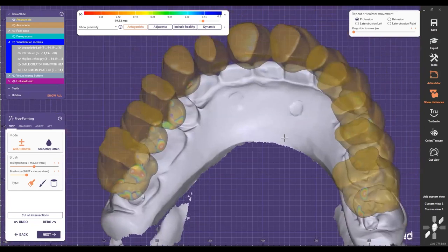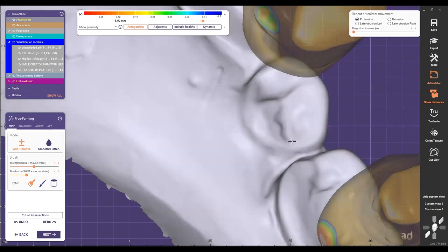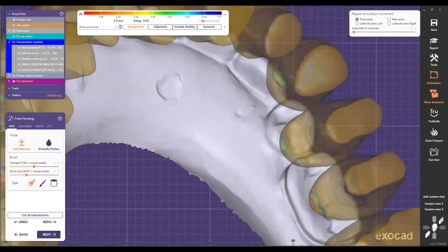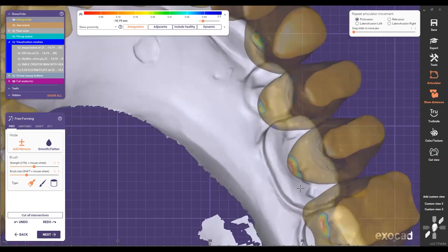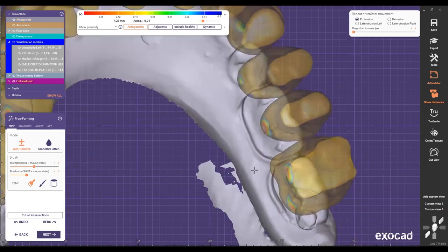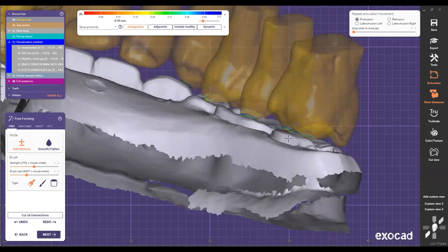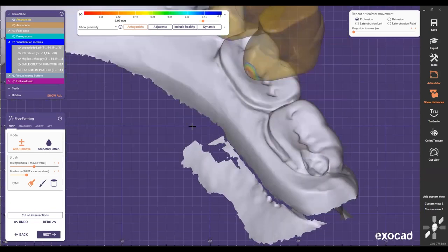And then from here, I can just pull this one here and try to hit it right in this right ridge, the distal ridge right there. This is hitting kind of like the fossa. I can push that in, right there in the fossa, and get rid of this contact right here. One thing I can tell the doctor, if I want to leave an ideal design right there, is, hey doc, just trim that tooth more. Okay, so I still have those options.